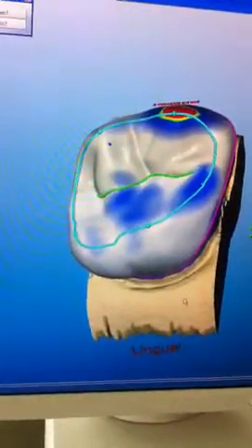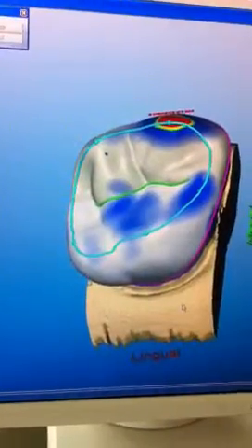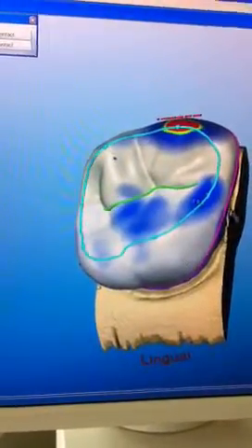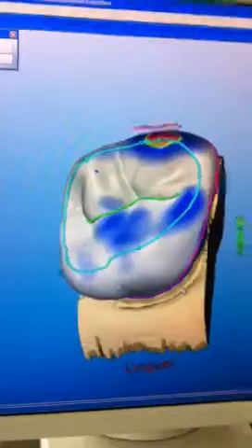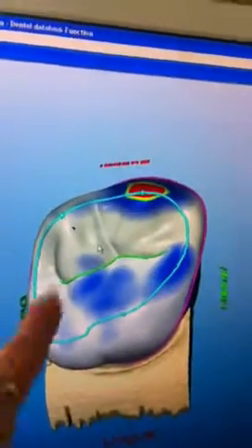So whenever you want to manipulate part of the tooth, the part that's in the lighter white is the area that's going to be manipulated whenever you adjust the scale tool. Bear in mind how the scale tool is set up. If I want to change anything in this blue area, I click on it first, then go to the scale tool and change things. The hands add more material, and the round things down here bring it forward or backwards.